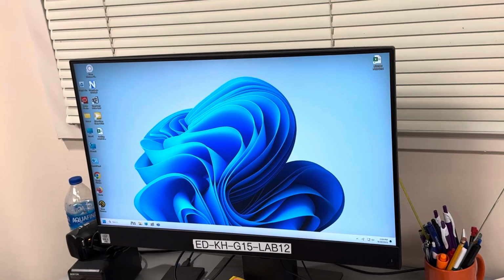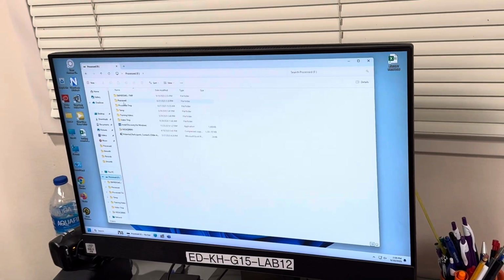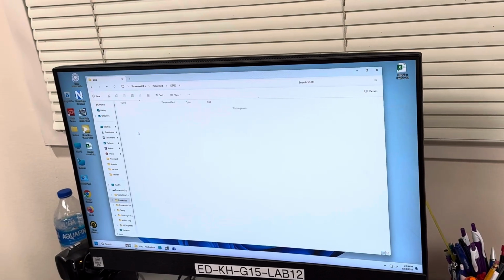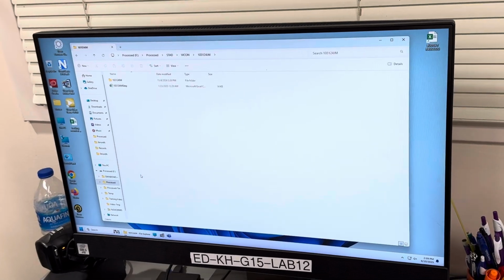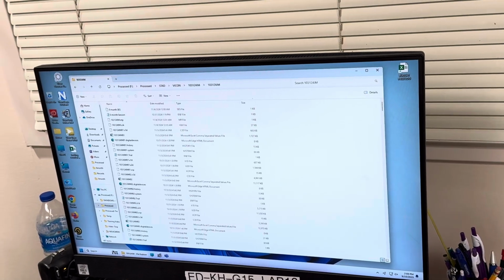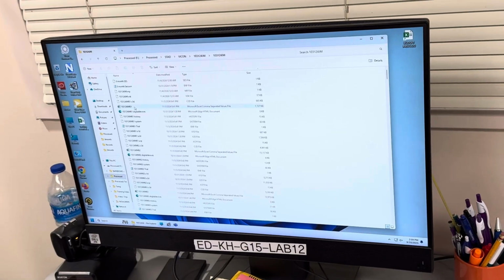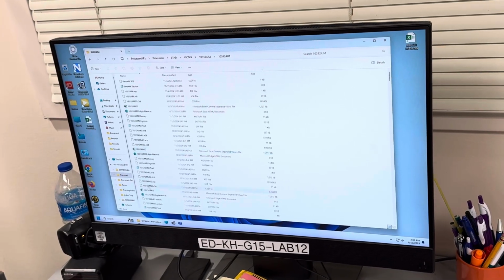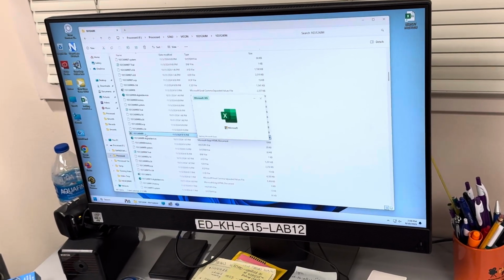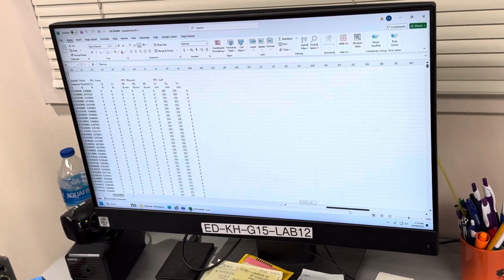If you ever looked inside those things that get exported once they're processed, I'll show you an example. In Vicon, if you look at things that have been completed, there's all these files, and all of these here are the exported CSV files. So the ASCII turns into a CSV, and for each trial, you have one of those files. So this is the calibration trial. If you open it to look at it, it's just going to look like a bunch of numbers. This is what it looks like, in case you're curious.